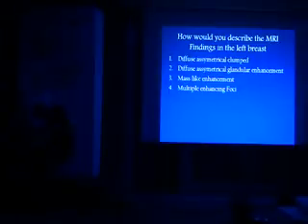The description, the term that you use in your description, is really reflecting your experience and knowledge in interpreting the MRI. So, who would go for the diffuse asymmetrical and clumped enhancement? How many? 1, 2, maybe 3.